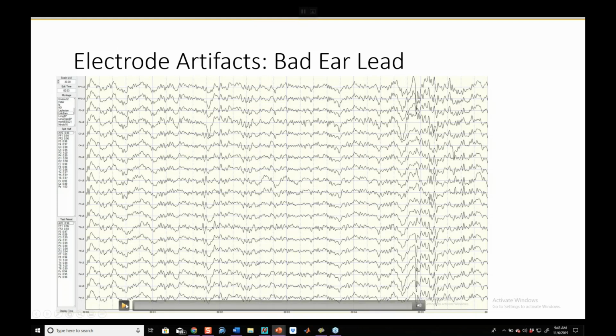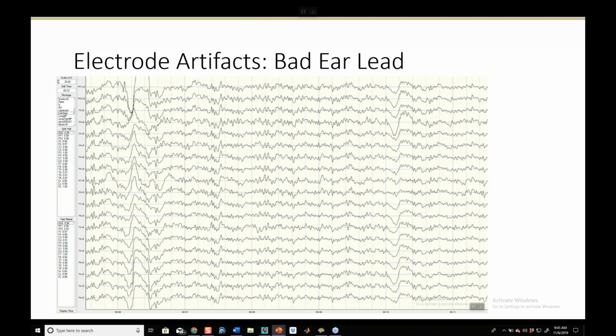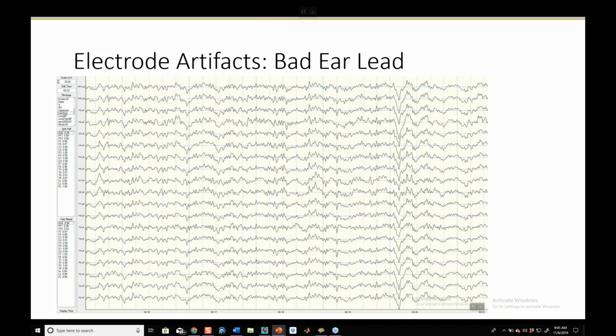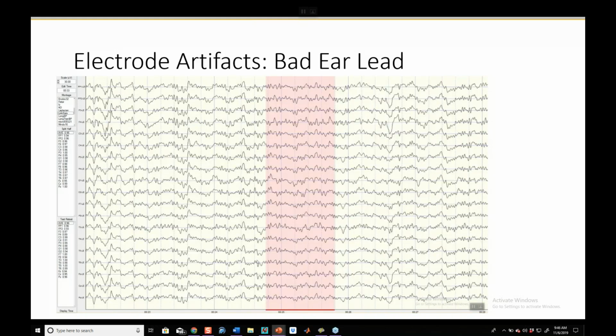And so you're hooked up and you're recording away and you notice something like this happening where every channel looks absolutely identical. Soup to nuts all the way through.